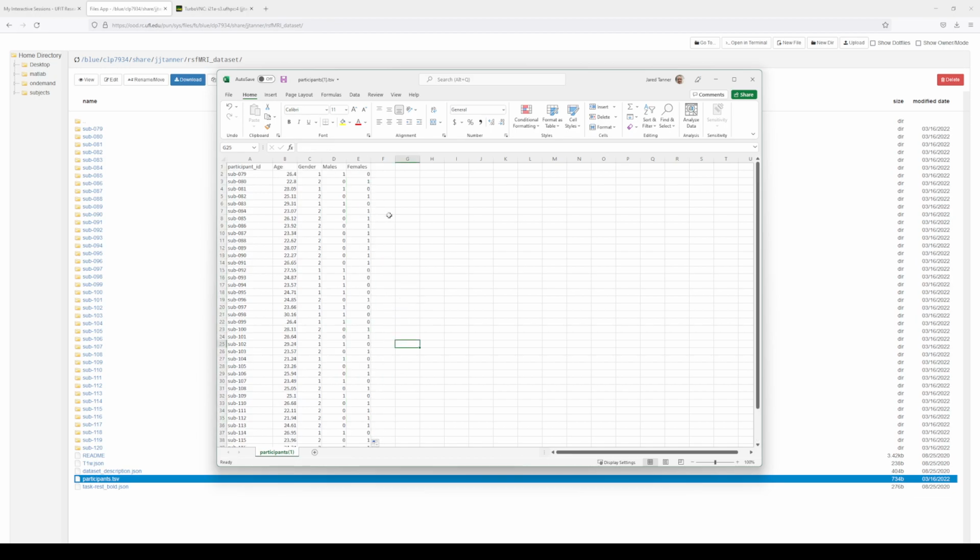So now we have two variables, and one is a 1 for male and a 0 for female. One is a 0 for male, 1 for female. And that will allow us to do a direct comparison between. And now we can do two more things.